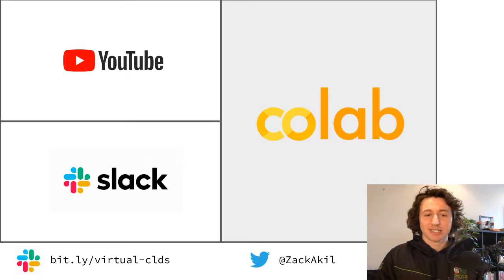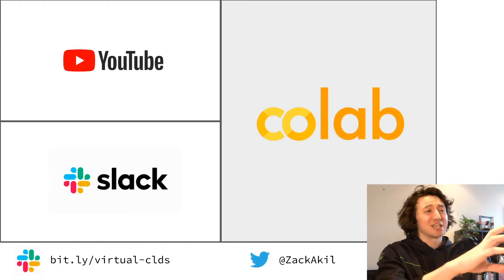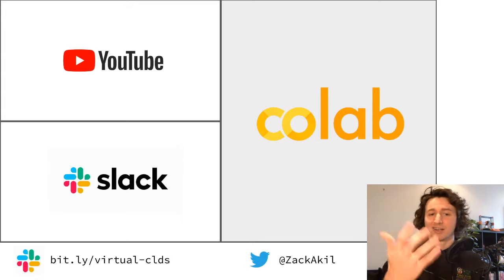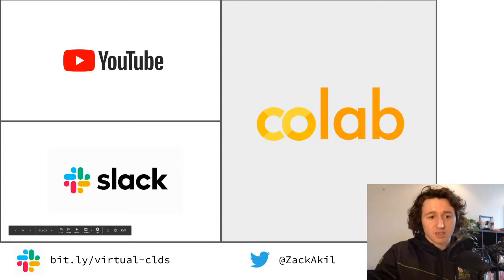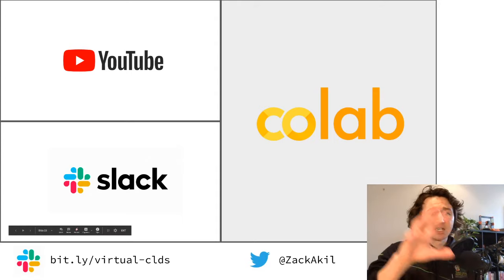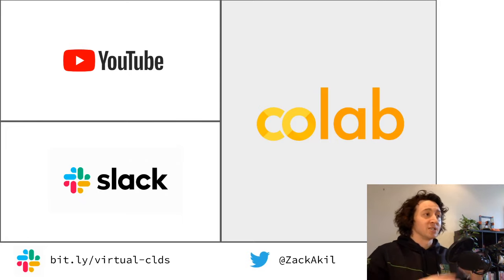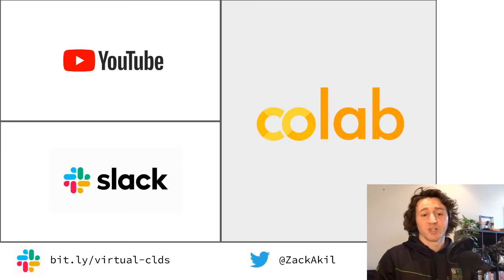So hopefully we're now going to share a link with you for you all to go to a Colab notebook. And I recommend you set up your screen to be in this orientation. The Colab notebook is going to open up inside a Chrome window. You don't need to install anything. But if you get it up onto, say, the right-hand side of your screen, put this video in some other corner, and then also get the Slack channel down in one corner as well, so you can keep up to date with everyone.